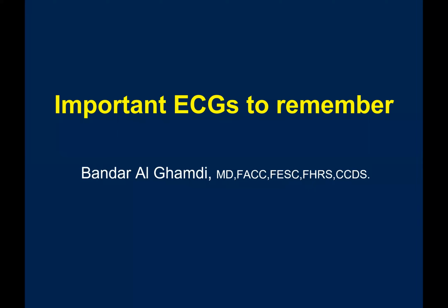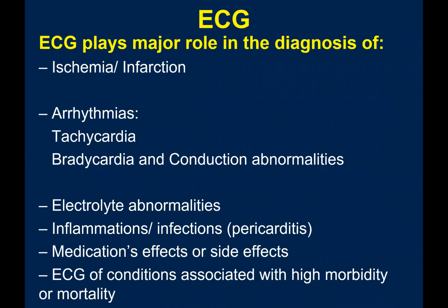So basically, today we'll go over important or interesting ECGs. Some of them are very basic for you, but common is common. So we'll start with the common things and then go to less common. ECG is important when it plays a role in the diagnosis and management of the medical condition we are dealing with. So ECGs of ischemia and infarction are important to distinguish between ST segment elevation and non-ST segment elevation.